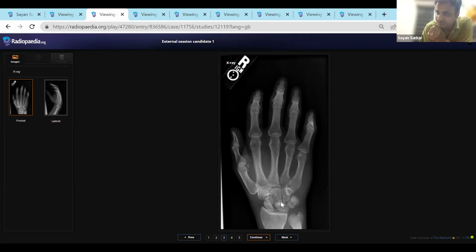And since it's a given history of a sports person, to say perilunate or lunate, that you cannot rule out on a frontal; you have to say it on lateral. And the next question that you answered correctly, what finding will immediately inform the clinician? Even if the patient has been left on screen, he has to be brought back because this is very notorious for causing median nerve injury and other complications. But the thing is that you have to pick it up on frontal if possible. If you cannot, you say I'm tracing the Gilula's arcs, and I think they're not maintained. I'm suspecting a carpal dislocation, but since I'm not confident, I'll go for an orthogonal view.